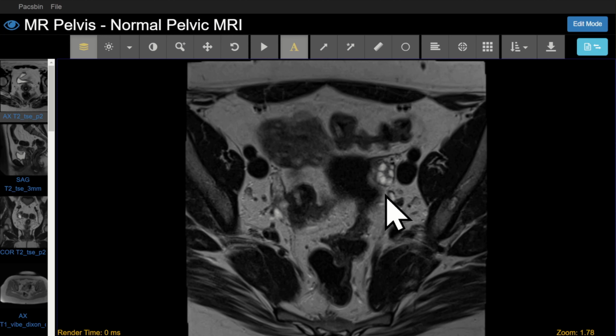One important skill on MRI is the ability to identify the normal ovary on MRI. And this is because you want to, of course, assess the ovaries, but also if there's a big mass in the pelvis and you don't know where it's coming from, the first thing you want to know is, is it coming from the ovary or something else? If you can identify normal ovary separate from the mass, then you know it's not coming from the ovary itself.